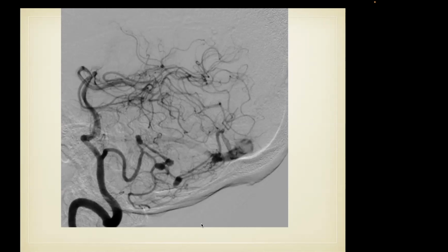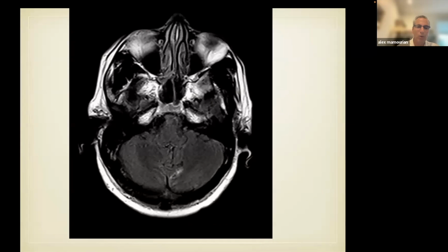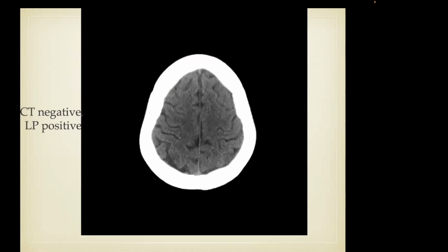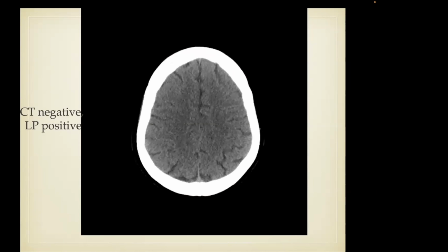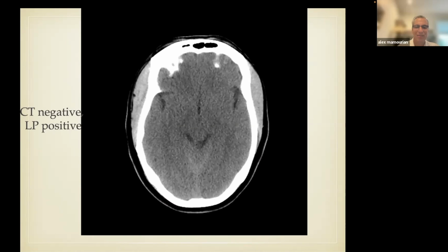Alex, could you go back to the CAT scan of the patient where you felt it was probably normal? Well, we're pretty sure it's not normal, but whether it would be read as normal is another question. Right. I mean, in retrospect, everything looks a little bit different. If you go to the level of the tentorium, yes, right there.